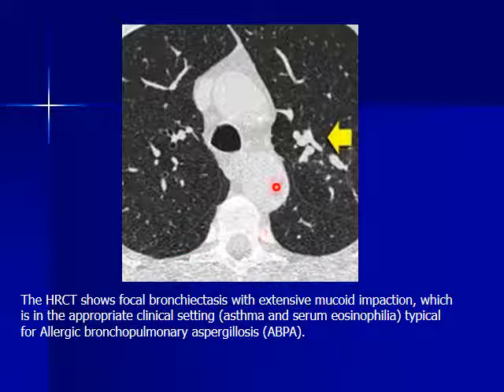A very important sign that you should know. As I've told you, each bronchus is paralleling an artery. You see bronchus and nearby touching artery.